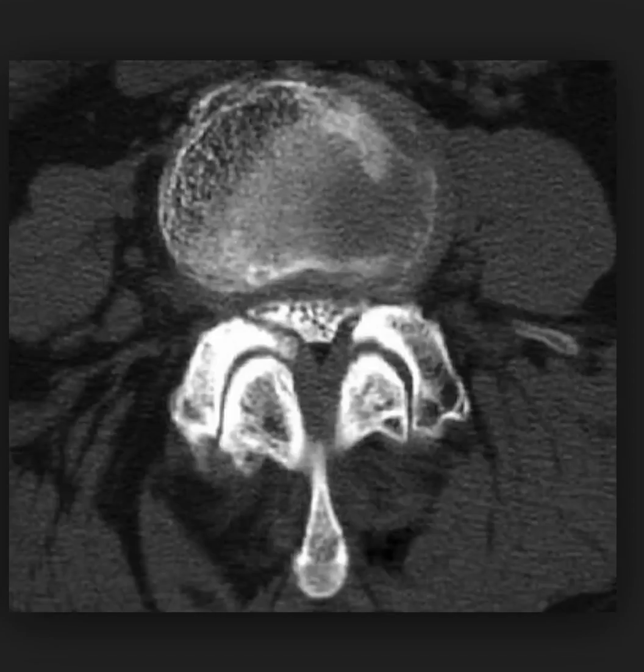Okay guys, a little information about lumbar spine stenosis. Just for clarification, I told you I would send you something. This is a great example of a CT scan showing the stenotic central canal here. So you see the spinous process here, transverse processes are really not noted, but here you have the facet joints. These are hypertrophied.